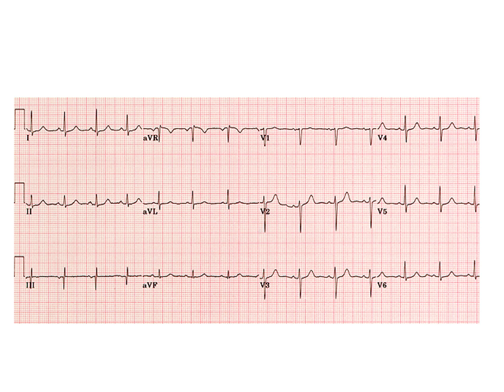So let's try to work out the axis of this EKG. Lead 1 is positive, so we know the electricity is going towards the left. Lead 2 is wholly positive, versus lead AVL, which has some negative deflections. It's a little bit tough to say, but there are no negative deflections at all on 2, so electricity is going downwards, and we confirm that by looking at lead AVF, which is positive. So it looks like the electricity is going just leftwards and slightly below the horizon, at about 90 degrees compared to lead 3, because lead 3 is isoelectric. So left and slightly down, a left dominant axis.